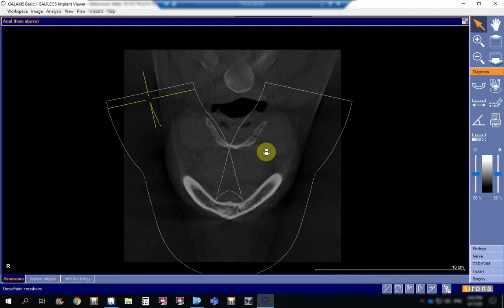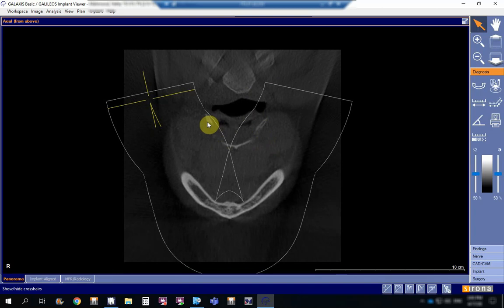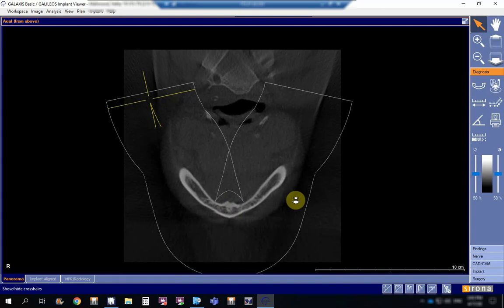I'm going up now. You can see that the hyoid bone has started to show more apparent, and these are the posterior horns of the hyoid bone. Okay, I'm going up. See these two extensions extending backwards. These are the genial tubercles, and this is the lingual pit or the lingual foramen. I'm going up.